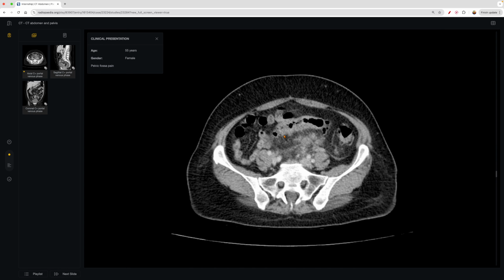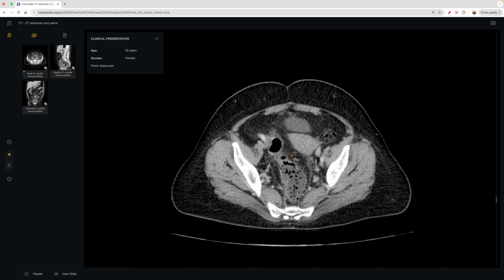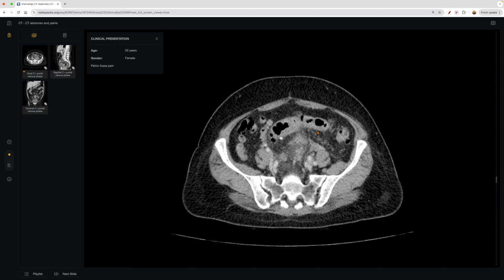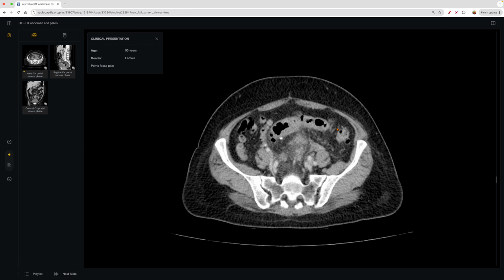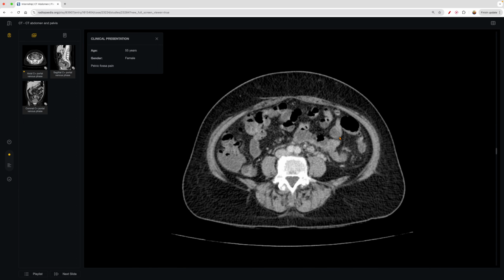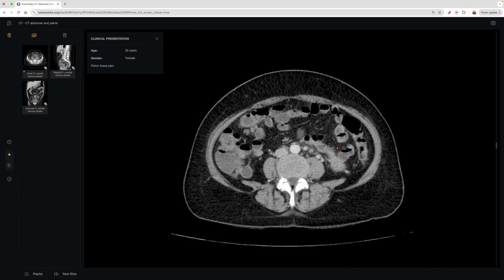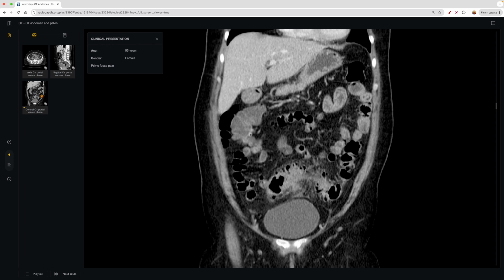If we look here, again, you can see all that inflammation right here. And then fecal matter, that's fine. And then you can see, again, I appreciate these little dark circles, and those are the little outpouchings coming from the diverticular disease. Alrighty, and then you can see that there. So that's a pretty easy thing to identify as a medical student.